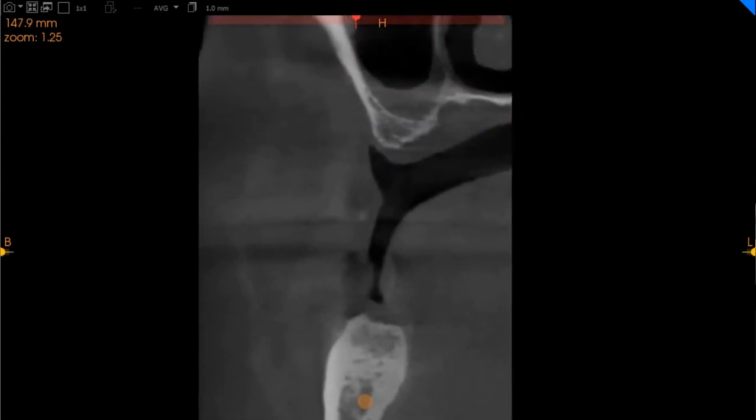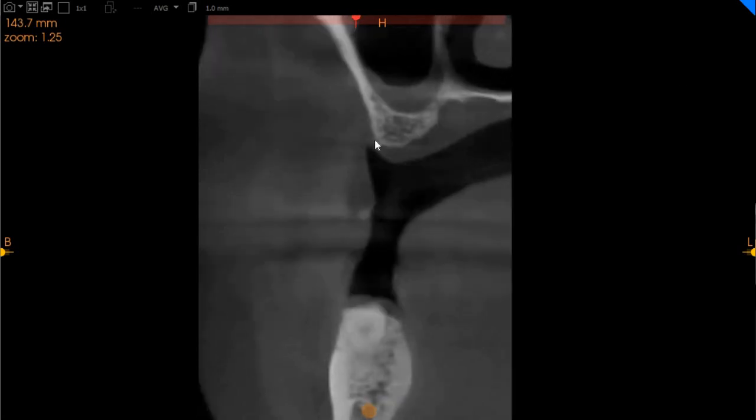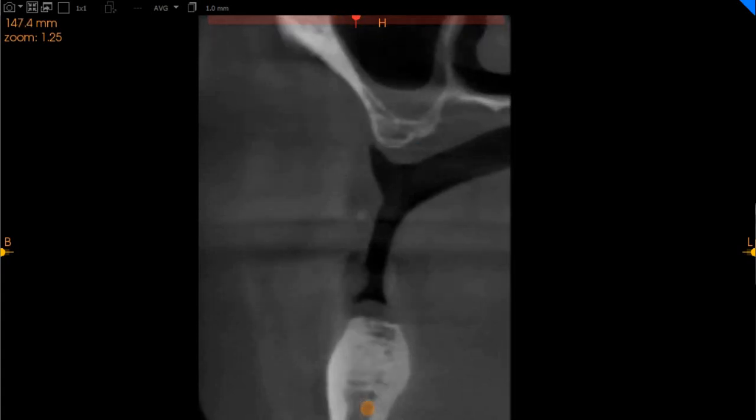By the end of it, the upper left quadrant is going to be our main focus. Next, the upper left first molar region, we've got slight bone here as you can see, but to give you a better idea, the ridge width is going to be 6.8 with the ridge height being just 4.6 millimeters. Sinus lifting will be required here as well, but as you can see, the sinusitis is not as severe as it is on the right hand side.